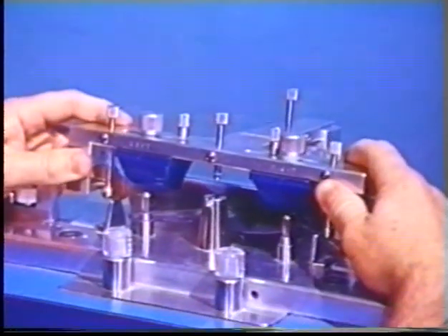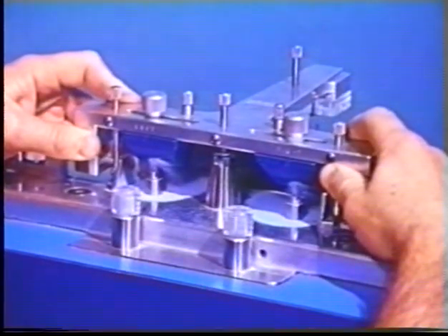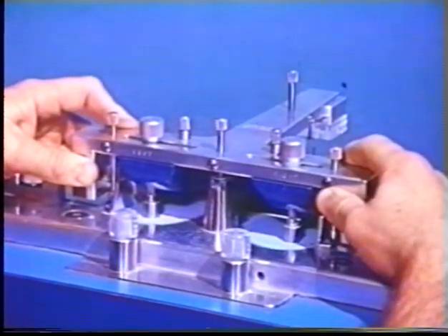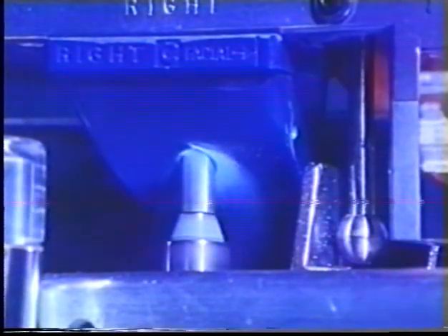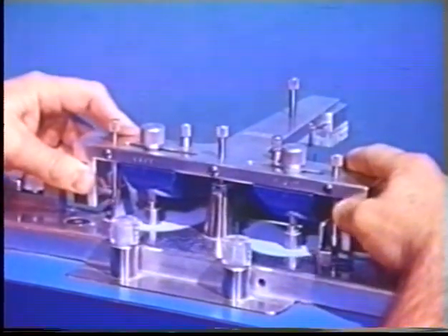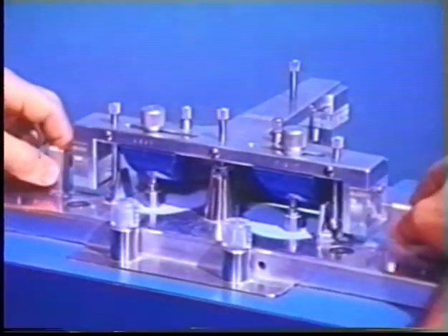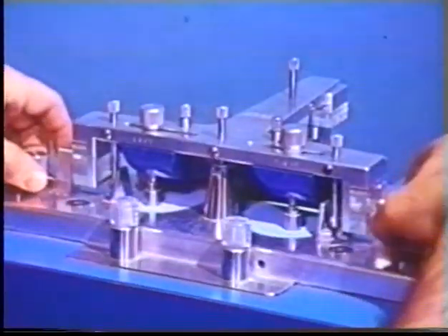The analog blocks are lowered slowly over the hemispherical-ended analog mills to form centric openings. The frame is guided precisely downward to centric by a series of 4 vertical posts, one of which can be seen to the right of the blue block. After the centric openings have been generated, the guide pins are reinserted and locked into the centric portion of the protrusive recordings.